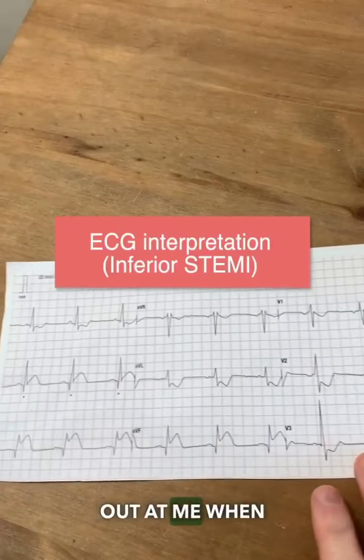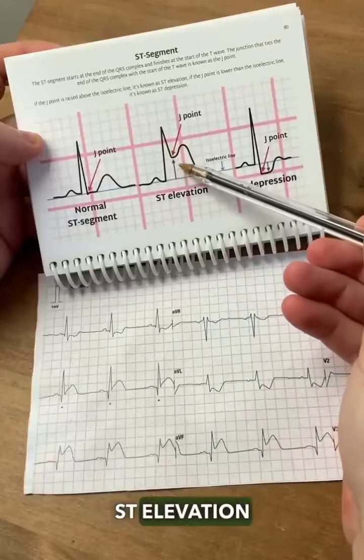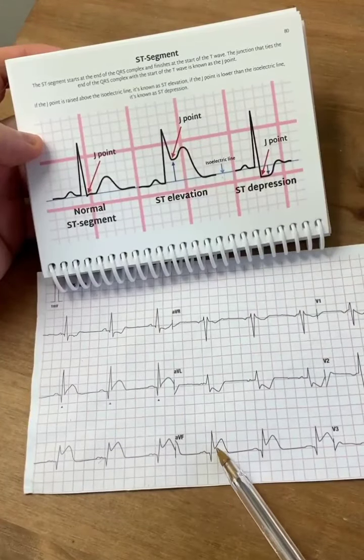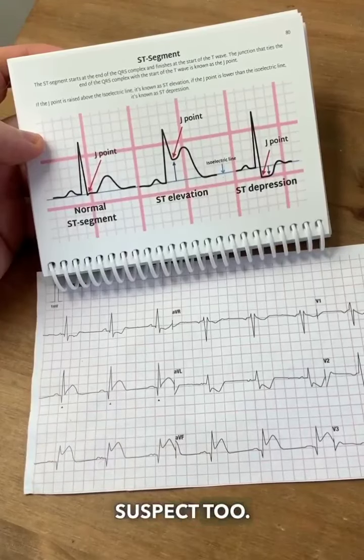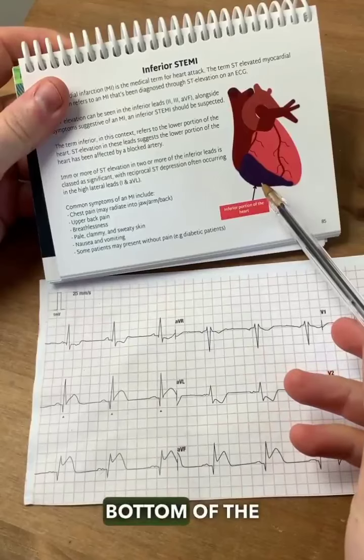The first thing that jumped out at me when this ECG printed out was the pathological Q waves and ST elevation I could see in lead 3 and AVF, with lead 2's ST segment and Q waves looking suspect too. These are the inferior leads, which means these leads look at the bottom of the heart.